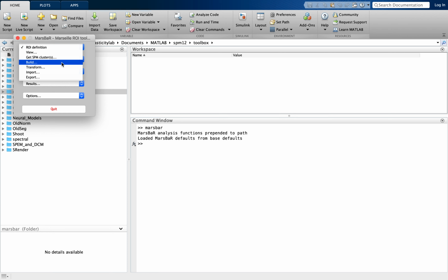So what I wanted to do now is just to take the position of this area, so take the MNI coordinate for this area I took from Neurosynth, and build some spherical ROI which have a radius of 10 millimeters and that I can use for analyzing my data.